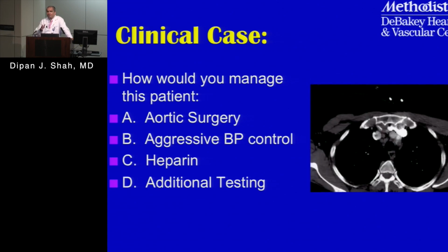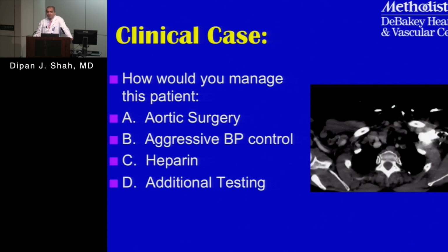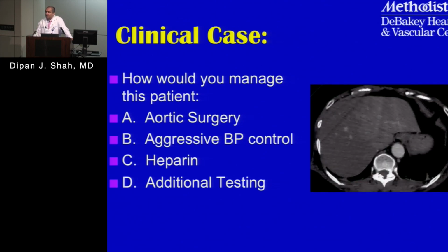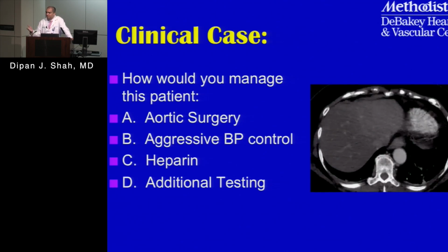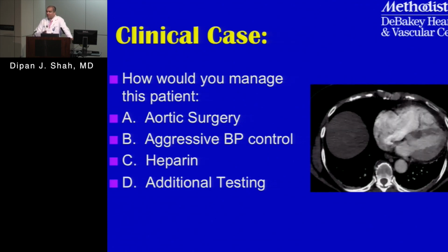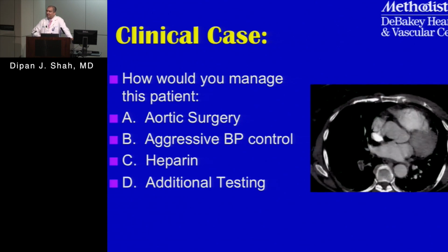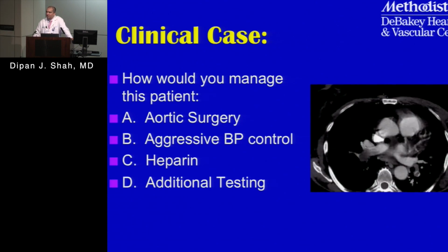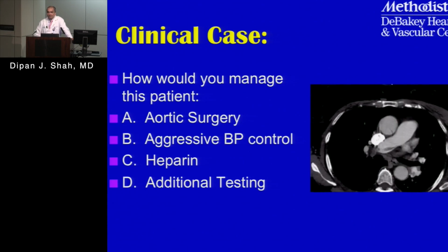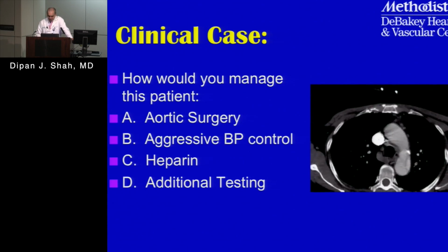And her kidneys, I think her creatinine took a bit of a bump, but she's gotten two doses of contrast. So you don't know if it's just due to the contrast or something else. Certainly on this imaging, you don't see anything to suspect compromise by dissection of the abdominal aorta, because this really looks like it's localized primarily around the arch and isthmus area.